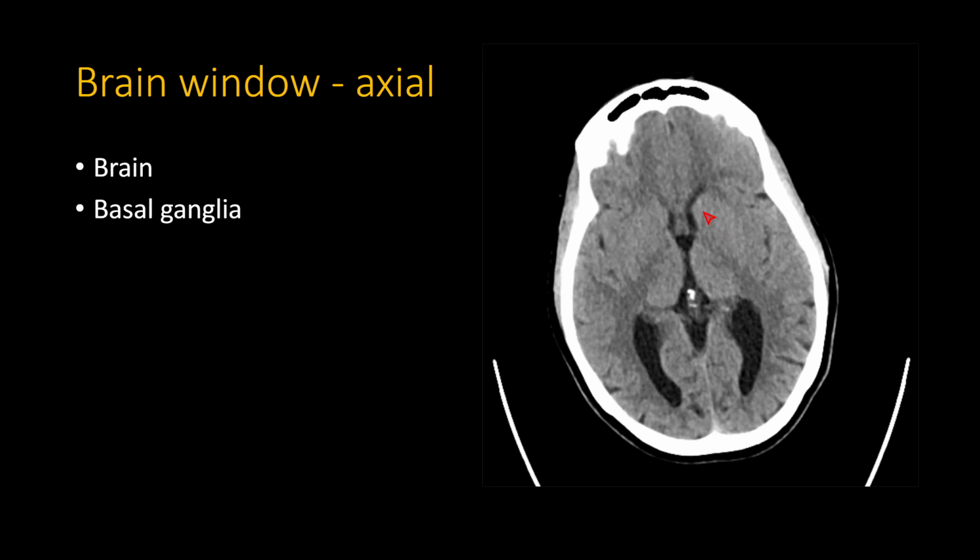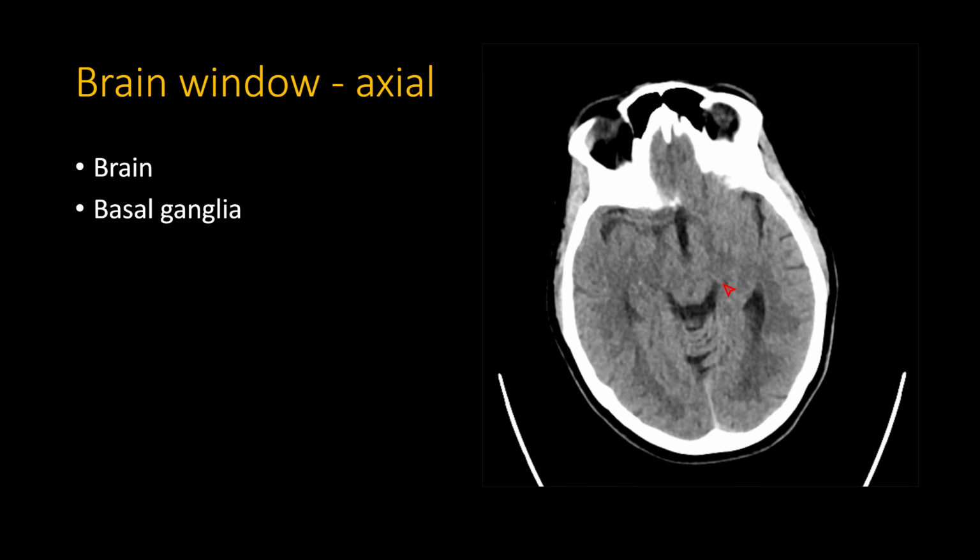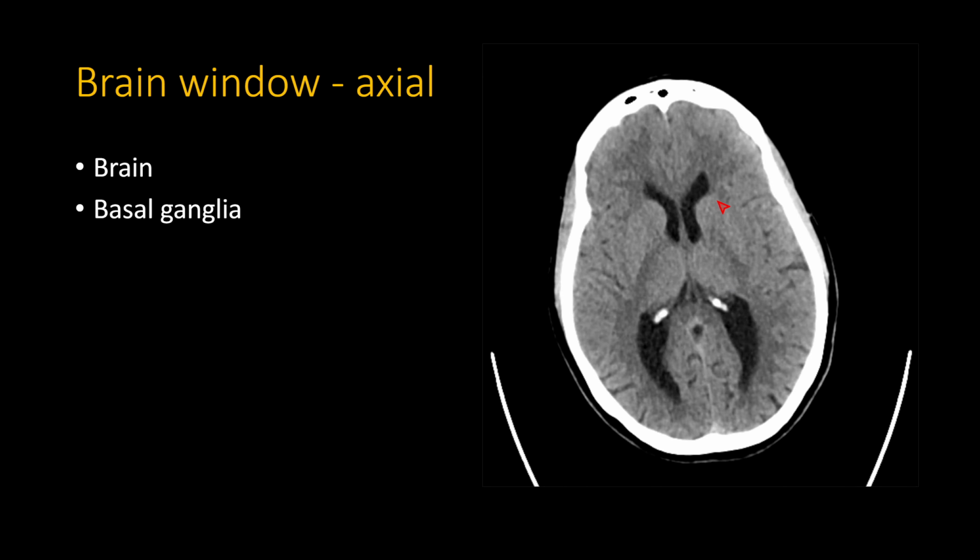And then aside from the basal ganglia are, of course, the thalami, and those are these medial structures. They're those sensory relay stations. And just also a reminder, basal ganglia is different from thalamus. So thalamus is not technically part of the basal ganglia.